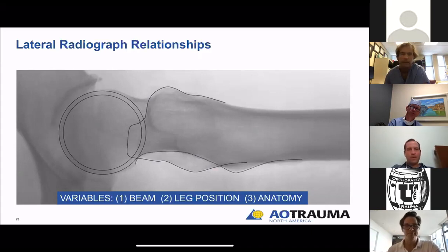All right. Posterior neck shadow, confluent, I think that's really nice to use. Anterior neck shadow, compromised by the greater troch in this perfect lateral x-ray. We'll talk about some other ways to see, okay?